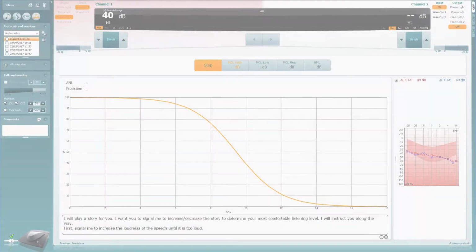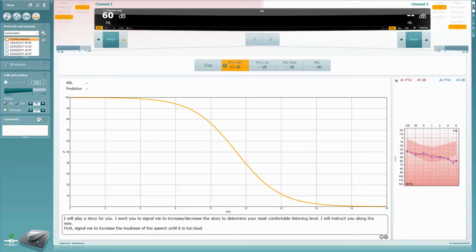The acceptable noise level test is a method of predicting the success of your patient ahead of providing amplification. This gives the benefit to both the clinician and the user, as it estimates the patient's success using amplification and also helps when setting expectations for the patient's rehabilitation.